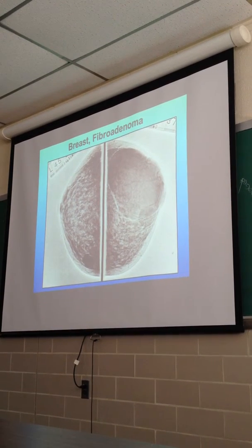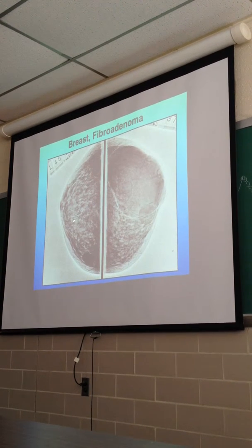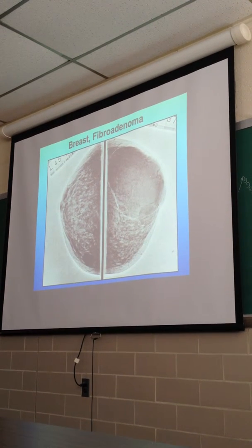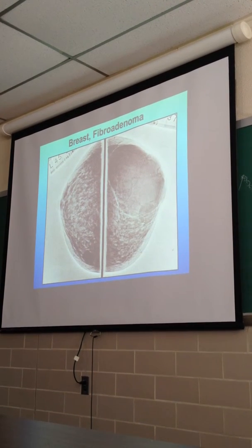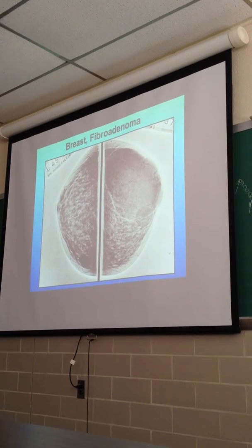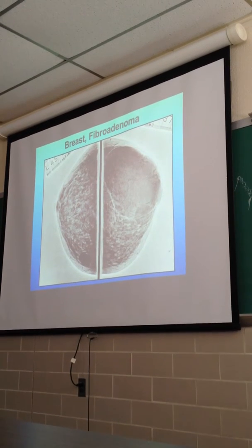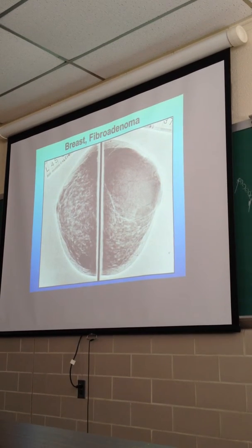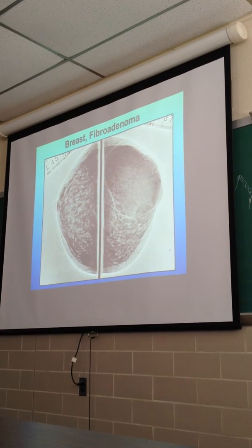And what else is going on with this breast? Fibrosis. Fibrocystic disease, yeah, pretty significant fibrocystic disease. And she's got multiple fibroadenomas, presumably. Clinically, if you saw this mass right here, would you suspect that mass is benign or malignant? Benign. Would you use the mammogram as evidence to substantiate it is benign? No, you wouldn't. You don't make a decision like that using a mammogram.